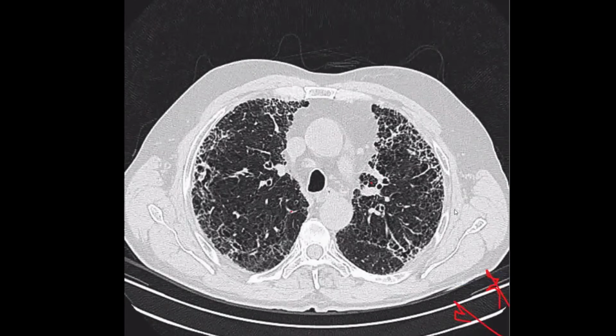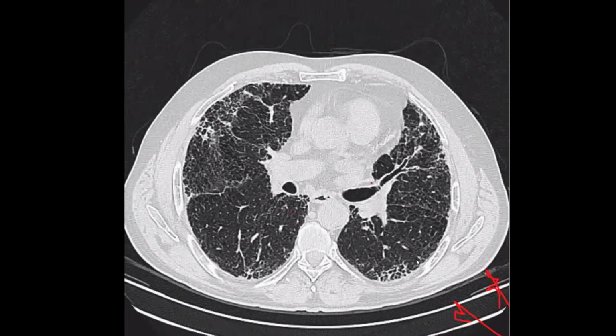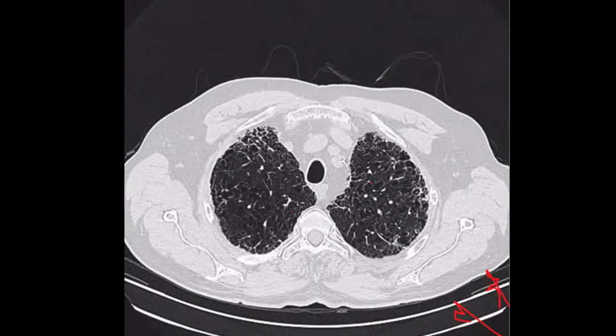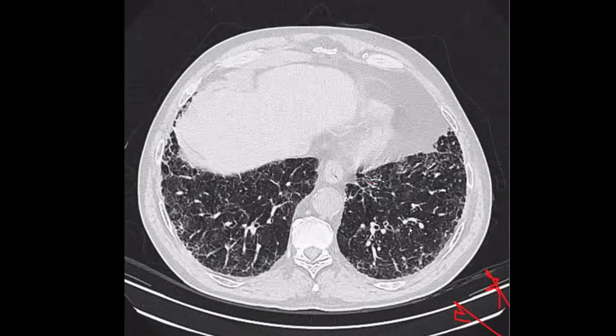I'm sorry, can you please repeat again? What did you say in the last words? You told me that we have intralobular emphysema. Yes, sir. Very nice. What type of emphysema? Yes, sir, so these are centrilobular emphysematous changes. You are right. So I think you got the idea of this patient.